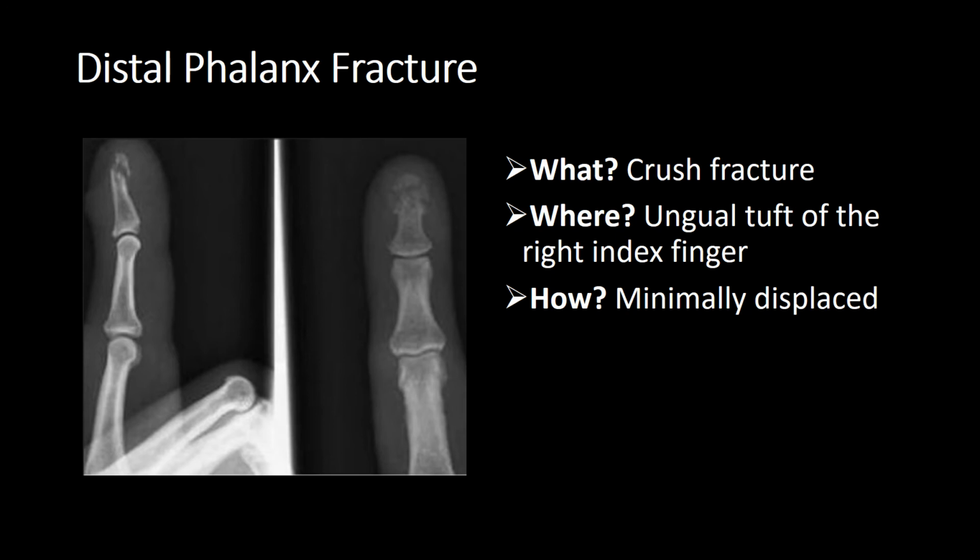So what is it? It's a crush fracture. Where? The ungual tuft of the right index finger. How? Minimally displaced.